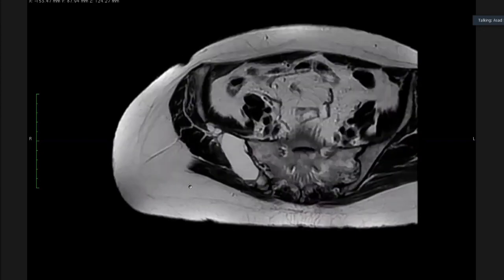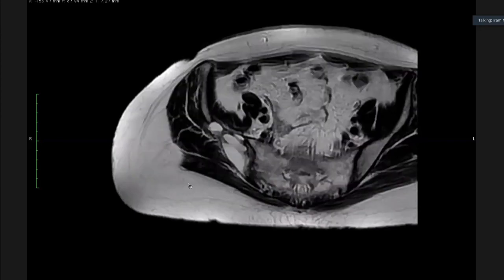Why would it be hypointense? Because it is a hypercellular tumor, it usually appears hypointense on T1 as well as T2. Not all hypercellular tumors appear hypointense on T2 apart from that. It can have hemorrhagic components and a lot of fibrosis in it. That is the main reason. That has got hemosiderin, so it will appear hypointense on T2. Anyways, that's by the by.